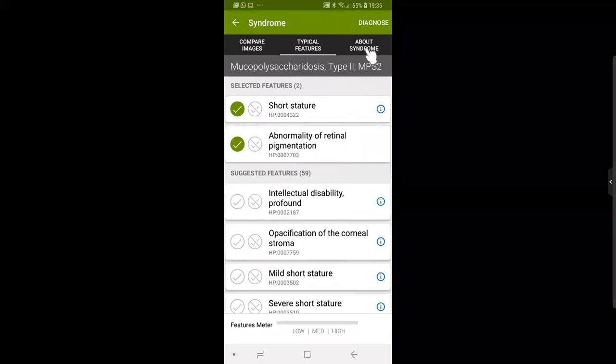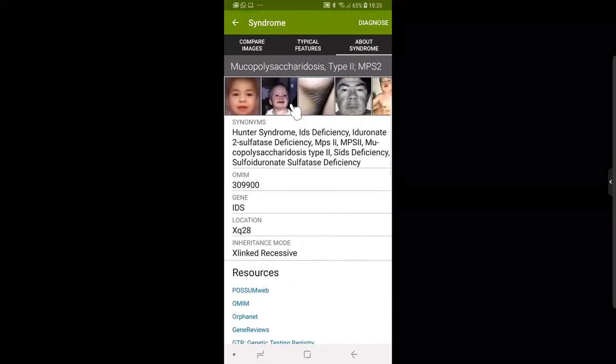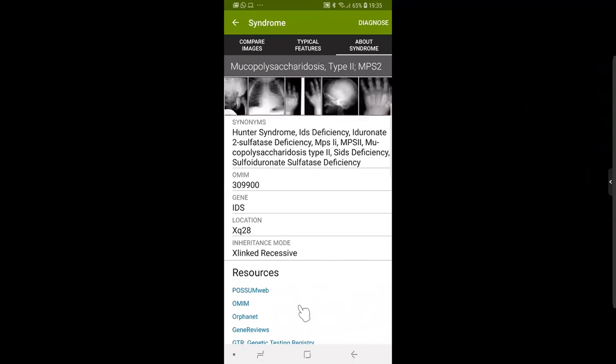But before we go back, I want to show you one more possibility, which is to learn what the London Medical Databases is showing us. This is a vast, large database that is showing me also X-rays, MRI images, and other information that can be extremely relevant for what I need. It gives me also some information and links to other resources.